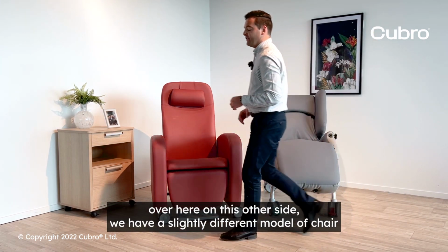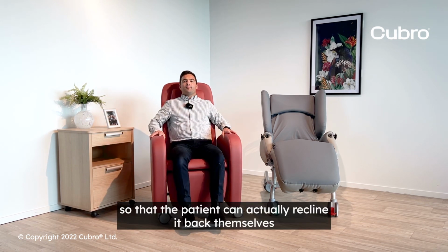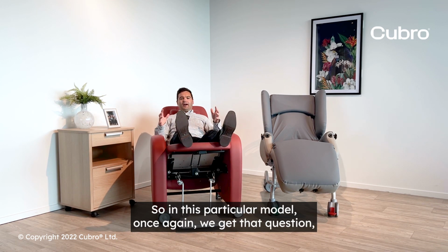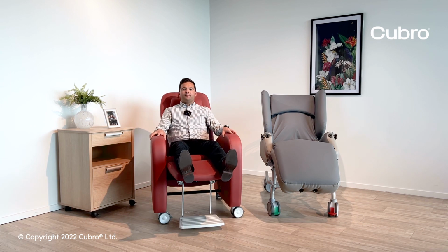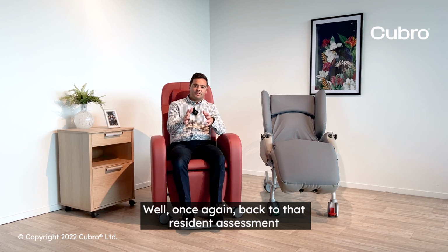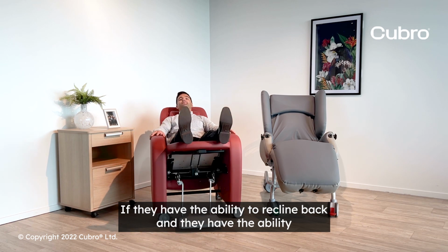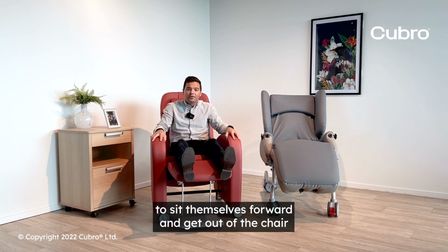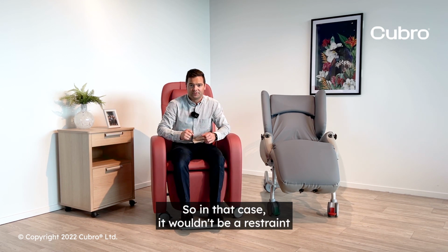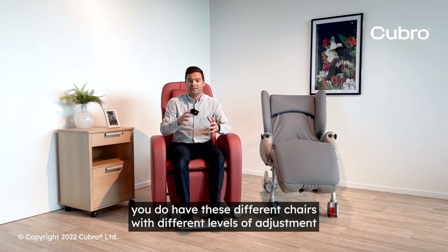Over here on this other side, we have a slightly different model of chair. This style chair is designed so that the patient can recline it back themselves. So in this particular model, once again, we get that question, is this a form of restraint or not? Well, once again, back to that resident assessment. Does it limit their normal freedom of movement? If they have the ability to recline back and sit themselves forward and get out of the chair, well, no, it's not limiting their normal freedom of movement, so in that case it wouldn't be a restraint.